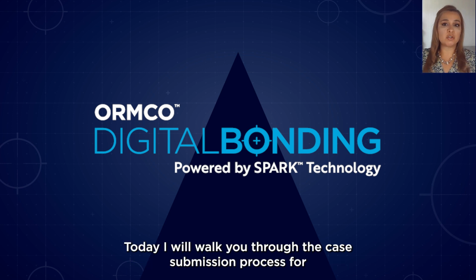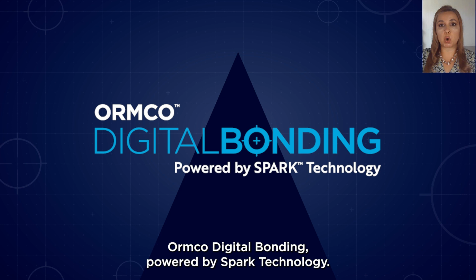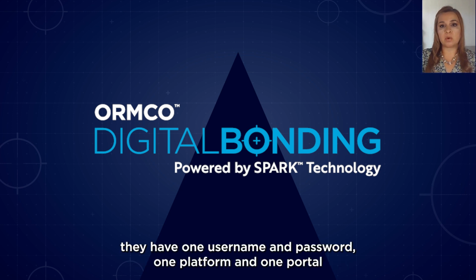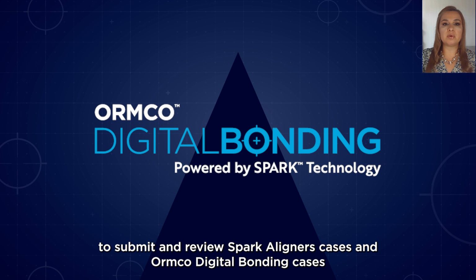Today I will walk you through the case submission process for Ormco Digital Bonding, powered by Spark Technology. When doctors use both clear aligners and Ormco Digital Bonding, they have one username and password, one platform and one portal to submit and review Spark Aligners cases and Ormco Digital Bonding cases.